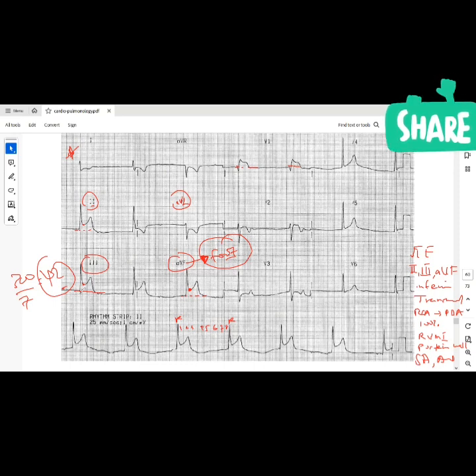No. So what does the patient have? How would you describe the heart rate? The heart rate is what? Bradycardic. Okay. Is that evidence to tell me that there might be SA or even nodal involvement? Yes. Does that correspond to our prediction of the infarction in this person? Yes or no? Yes. Does this make sense?